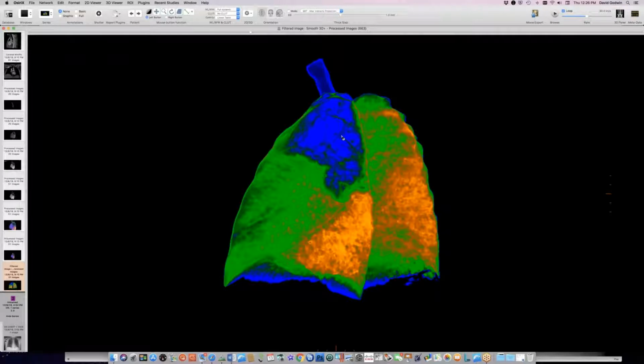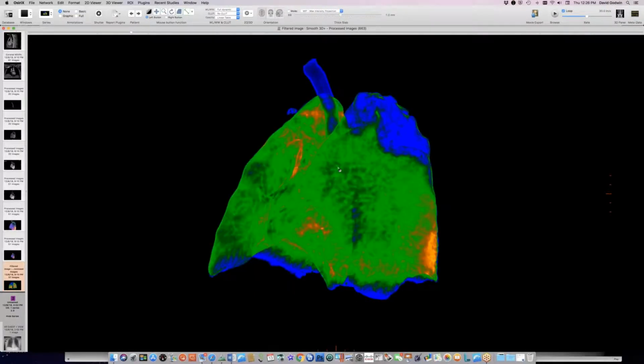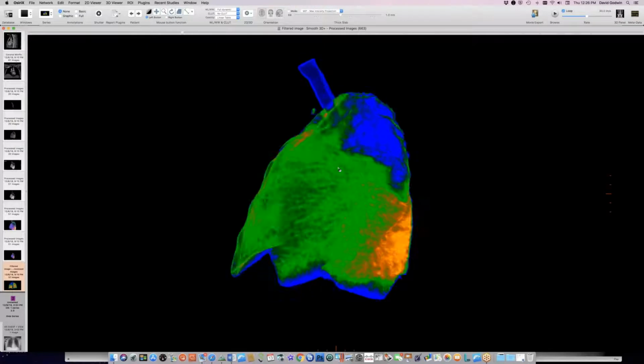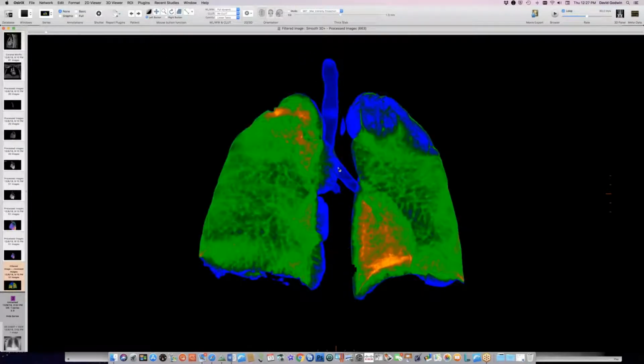It looked, initially on the CT scan, as if it might be overlapping into superior segment of lower lobe. But I think what's happened is that the lung is expanded there where it's rarefied, and the fissure itself is being just pushed down. So I think that the fissure is a little bit depressed, and this is all indeed in posterior aspect of an apical aspect of upper lobe. So I think this color rendering is kind of nice, showing the different lung densities.